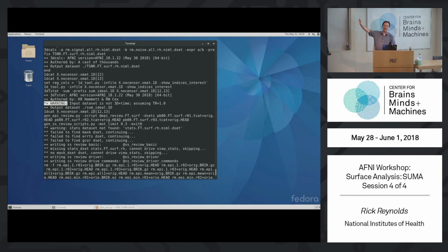For the most part, these things are benign. It's good to look at them and understand where they come from. Some warnings are okay, some are bad. That's why they're warnings. You can't necessarily say for sure whether they're okay. In this case, they are.